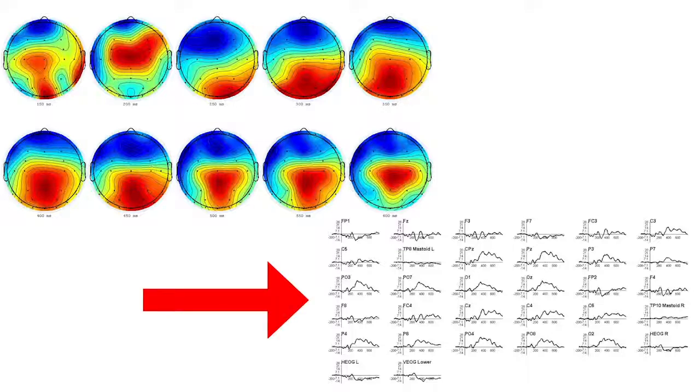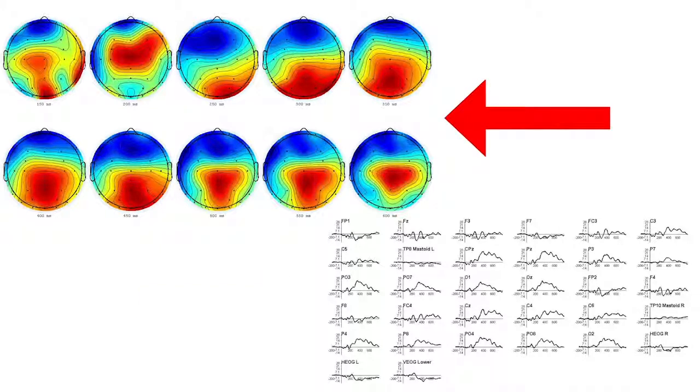Waveform graphs show you detailed information about changes in electrical activity across time as measured by a single electrode. Groups of waveform graphs show you electrical activity across multiple electrodes to give you a better sense of the distribution of electrical activity across the scalp, but it is still difficult to see the topography of the activity. A topographical map shows you the distribution of electrical activity across the scalp at a single time point, but groups of topographical maps show you changes in this distribution over segments of time. Which type researchers use depends on the most important aspects of their data they wish to convey.